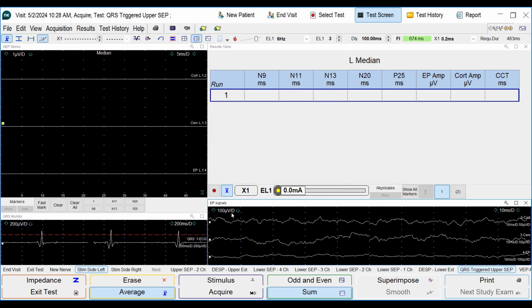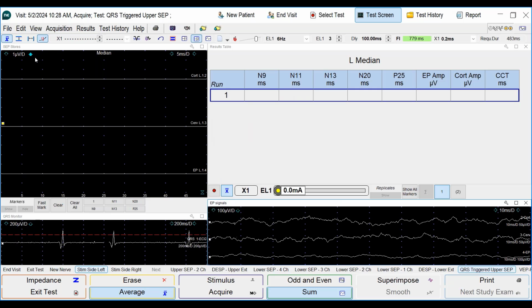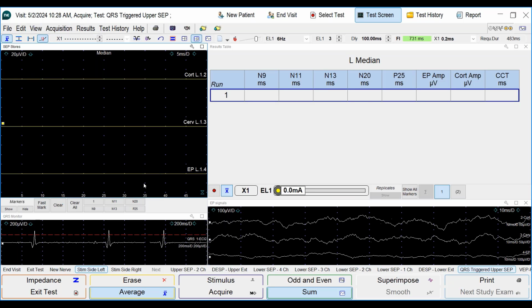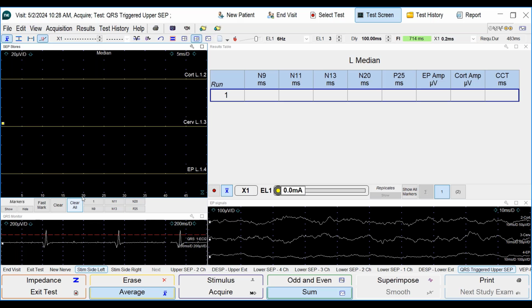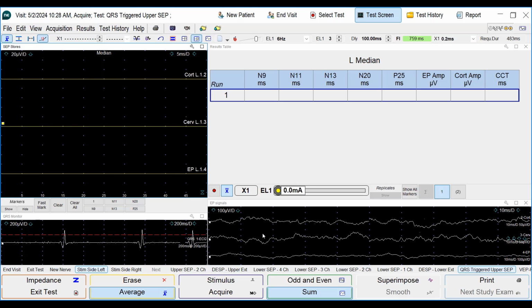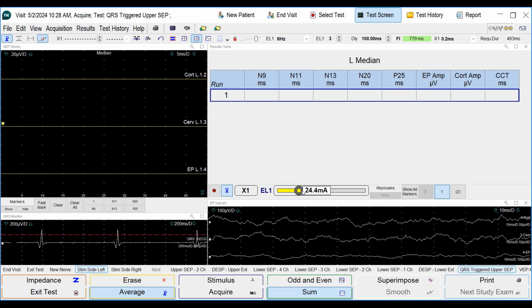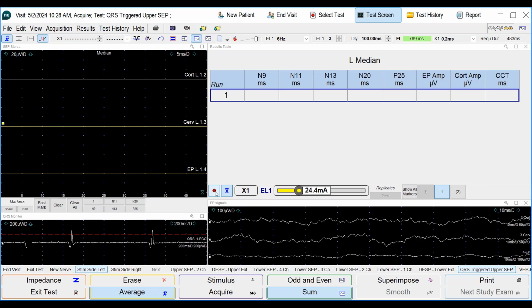In the interest of time, what I'm going to do is show you how the traces update. So you get an idea of what is happening. So you will see the EKG and the trace will be updated very rapidly. So here we go. No electrodes are placed. These are just open amplifiers.